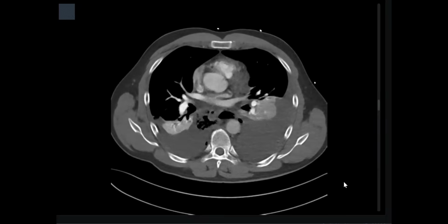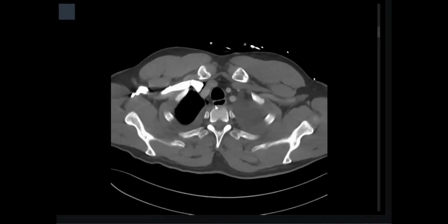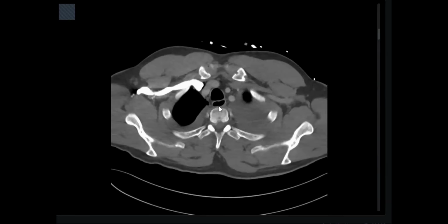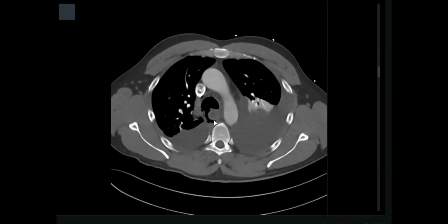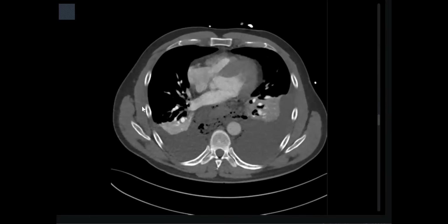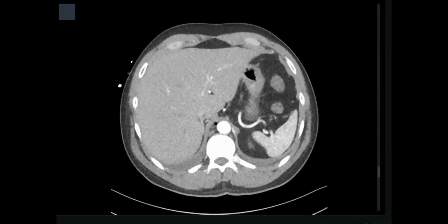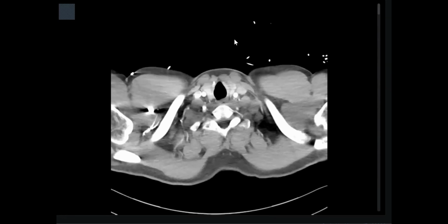I am now suspecting that this is esophageal perforation, and even from the start, esophageal dilatation is noted. It's uncommon to see the gas-filled esophagus like this, followed by some fluid within the esophagus. So you are suspecting Boerhaave syndrome. In my routine practice, I will check other windows and we may even give oral contrast.